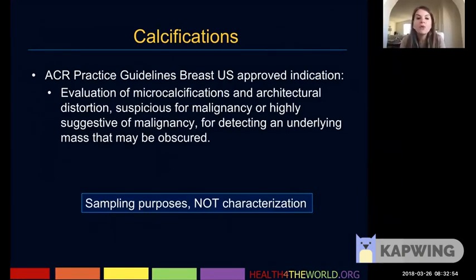So again, we do not have the resolution to characterize calcifications on ultrasound. You really need your mammography and your spot magnification views for that. But we do ultrasound to look for an underlying mass or to see if we can sample these calcifications with ultrasound guidance, which is much easier for our patients.